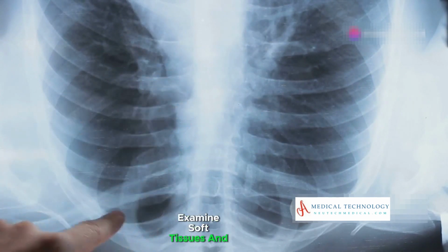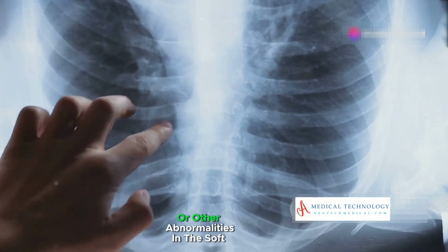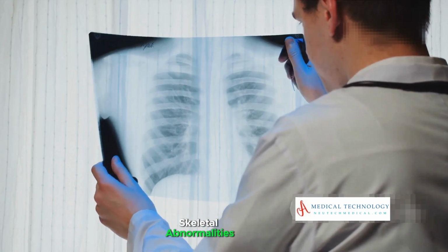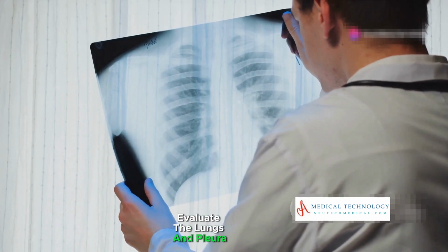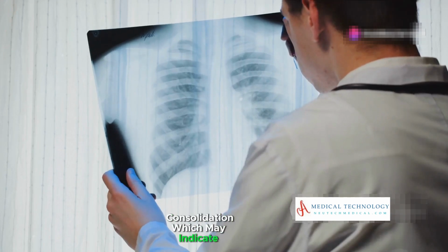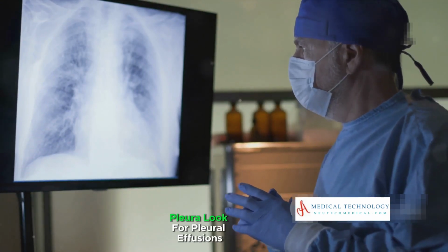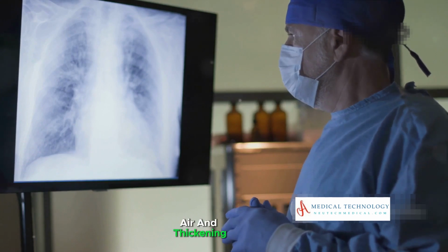Examine soft tissues and bones. Soft tissues: check for masses, subcutaneous emphysema, or other abnormalities in the soft tissues. Bones: look for fractures, lytic lesions, or other skeletal abnormalities in the ribs, clavicles, and spine. Evaluate the lungs and pleura. Lung fields: check for symmetry, masses, consolidation, which may indicate pneumonia, and other parenchymal abnormalities. Pleura: look for pleural effusions, fluid, pneumothorax, air, and thickening.